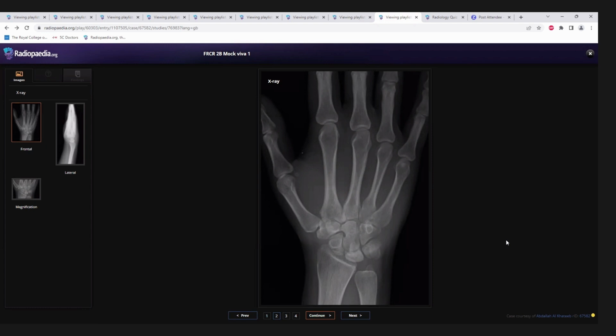What's negative ulnar variance? That means the distal part of the ulna will not be in line with the medial articular surface of the radius. And what is the measurement that we use? Measurement, I'm not so sure. No problem, please proceed.